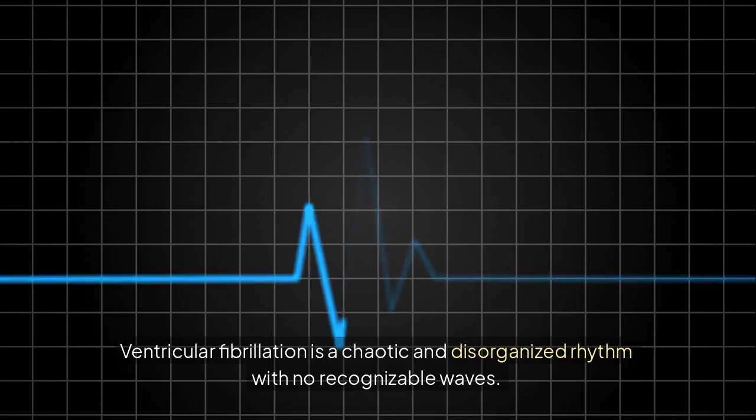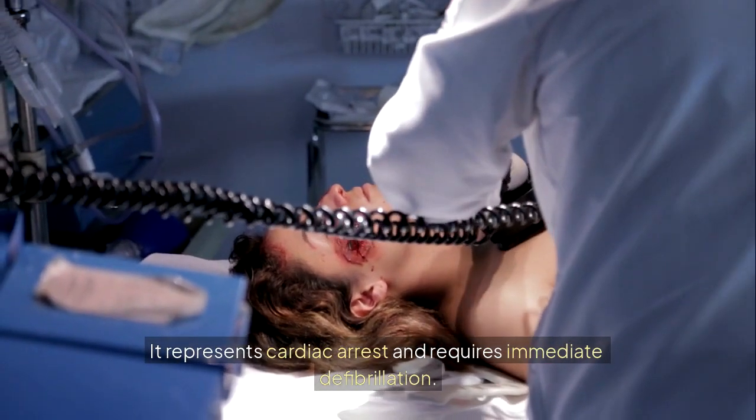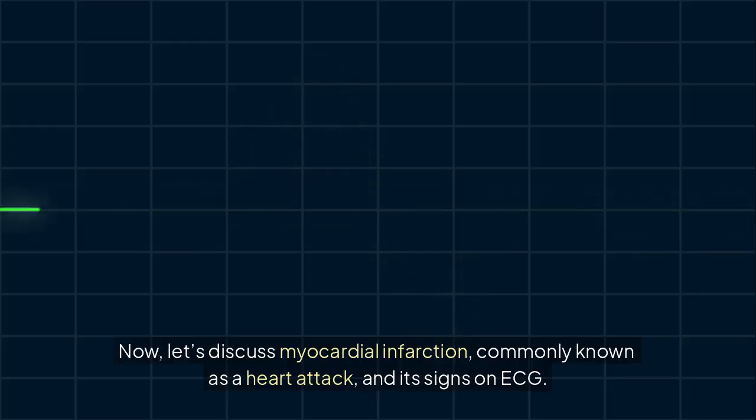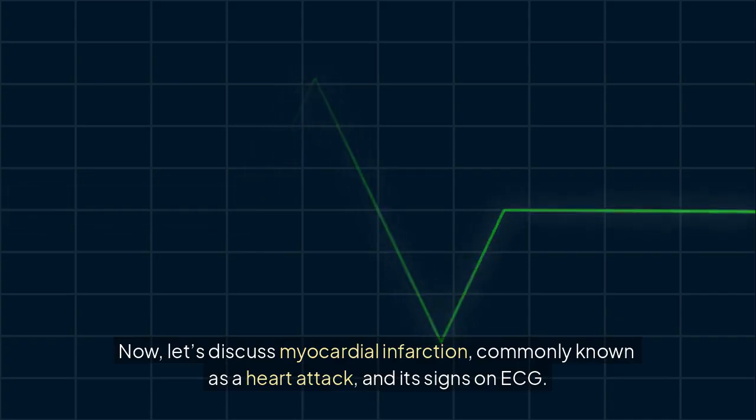Ventricular fibrillation is a chaotic and disorganized rhythm with no recognizable waves. It represents cardiac arrest and requires immediate defibrillation. Now, let's discuss myocardial infarction, commonly known as a heart attack, and its signs on ECG.